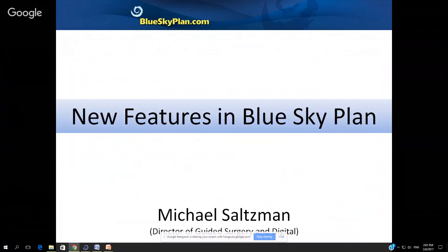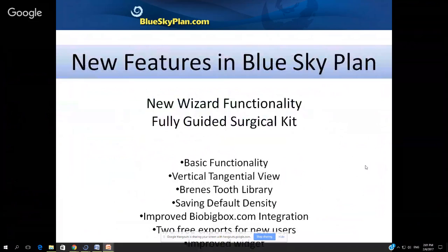The focus of today's presentation is going to be new features in Blue Sky Plan. We're going to be demonstrating in the software the new wizard functionality and the new support for the fully guided surgical kit in the software. While we do that, we're going to be going over some basic functionality in the software for users that might be new to the software.